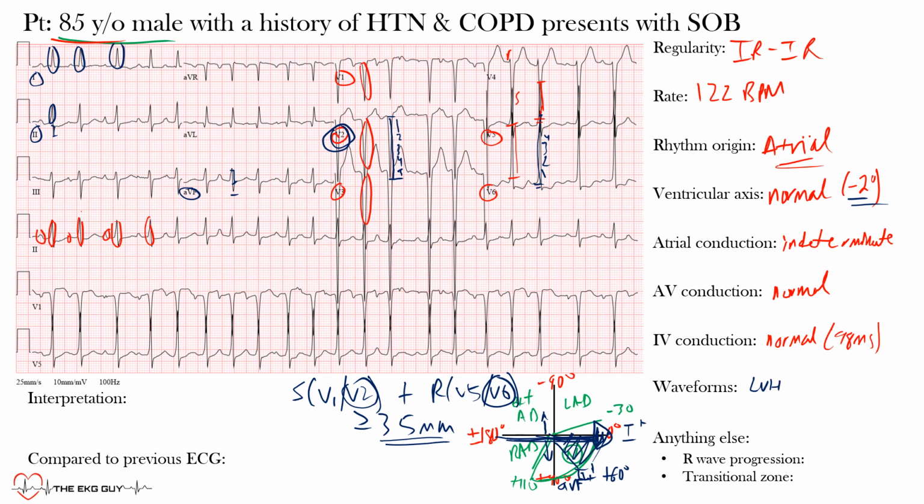We also noticed that we have discordance. What we mean is that the main QRS vector is up, and then we have ST segment depression and T wave inversion, which is going in the opposite direction. That's discordance, and we call those secondary repolarization abnormalities. And you see the same thing here. Notice that we have these deep Q waves and then upright ST segment and T waves.